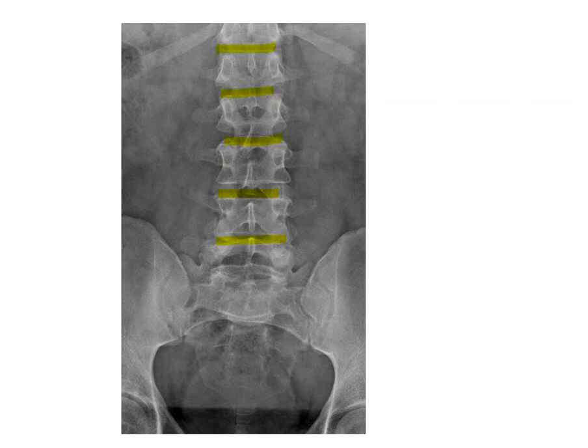All right, now let's find those little pedicles. I'm always talking about these pedicles. We look at these pedicles to be what we call symmetrical or equidistant from either the midline of the vertebra or equidistant from the lateral borders of the vertebral bodies.